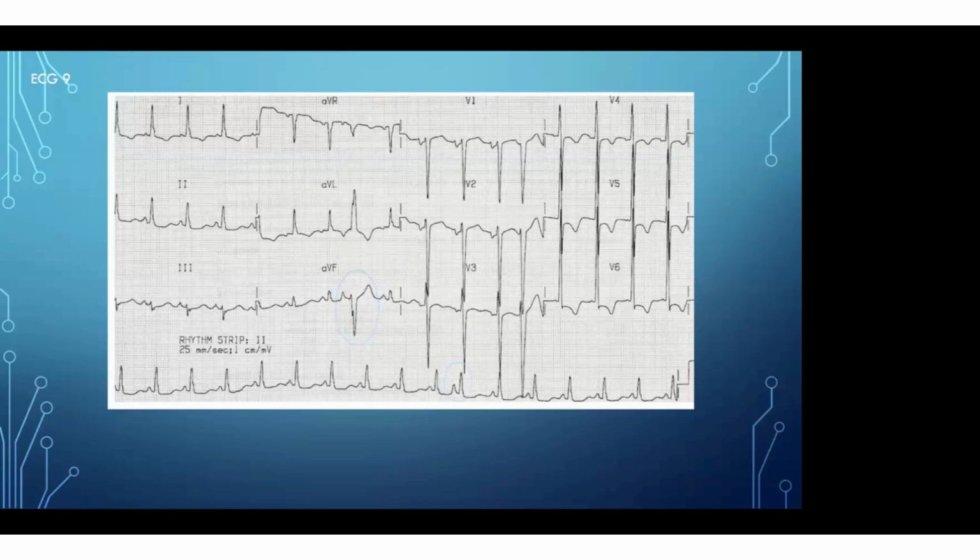This is actually a narrow QRS tachycardia with 1-to-1 AV conduction, P wave followed by QRS in all beats, and P wave morphology is slightly different in between the beats, 1 or 2 beats. And the coupling interval, RR interval, also varies when there is a P wave with altered morphology. This is an atrial premature contraction, which is coming in between.